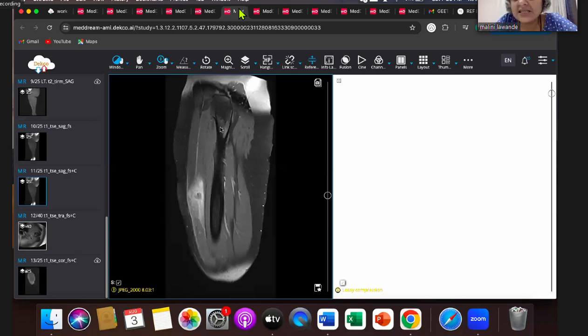Ruptured cysticercus? This is too large. This is a very large lesion. Cysticercus lesions are very small, a very small cystic lesion. And typically the history is there is a flare up, the patient gets pain, swelling, which then settles down, and again comes up. And the edema is disproportionate, but the size of the lesion is quite small. It's not this large.